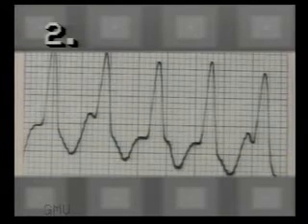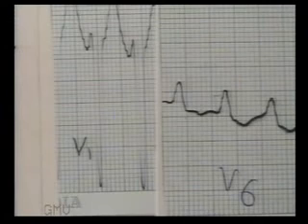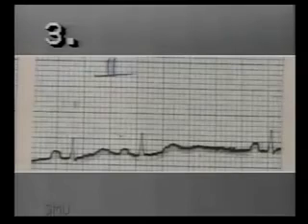So left atrial hypertrophy can also be diagnosed from a broad negative P wave in lead V1. This picture suggests ventricular tachycardia or supraventricular tachycardia with bundle branch block. RR interval is 9 millimeters, so the heart rate is 165 per minute. To differentiate the two conditions, see leads V1 and V6. A deep S wave in V1 and a broad R wave without Q wave in V6 tells us that this is left bundle branch block.